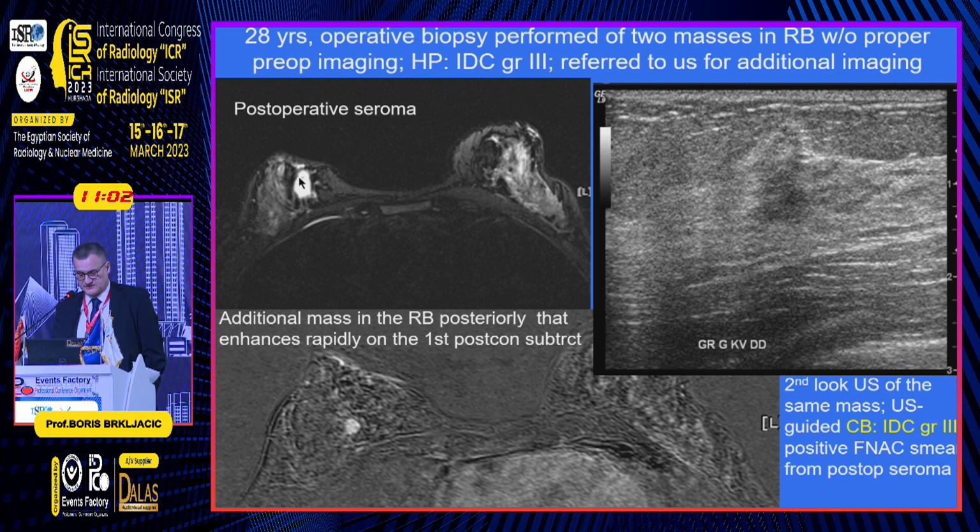This is a postoperative seroma, and on contrast-enhanced MRI, an enhancing lesion, which is vertical and irregular on ultrasound, and this was residual high-grade cancer. Unfortunately, she died.